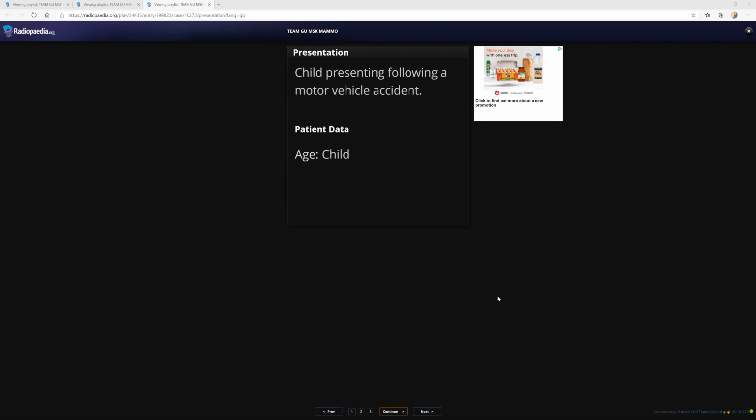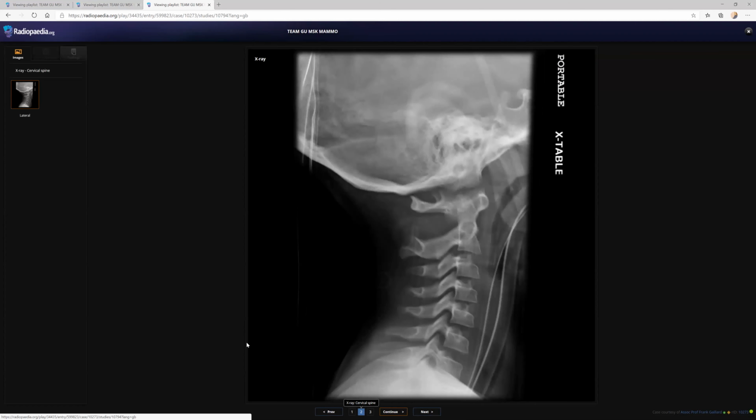So are you keeping the time, Sabah? Yes, I am. Okay, thank you. You can start. Yes, this is a child presenting with motor vehicle accident. This is an X-ray neck, cervical spine, lateral view.